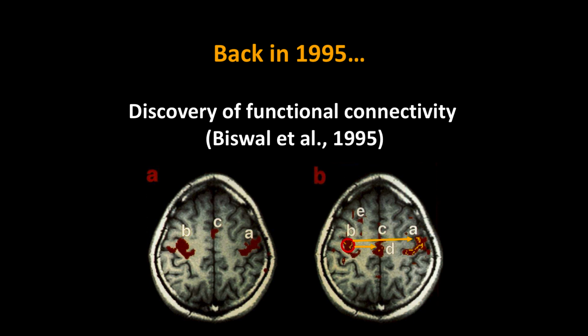It's a very vague term. I don't like throwing it around, but they would think that this is a way that you could indicate that. And you'll also notice it's not just within its opposite homologue, but also in some other voxels as well, such as the midline region. Let's say this is, I don't know, frontal eye fields or something. So what's exactly going on there? Because this isn't totally random. You find it's a pretty robust so-called network or constellation of correlated masks throughout the brain.